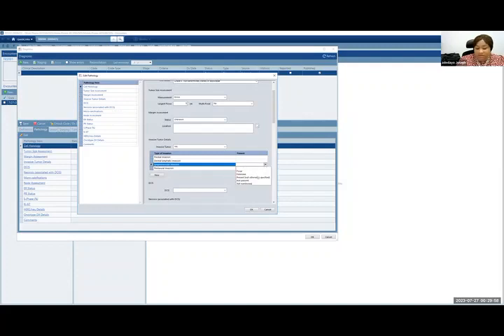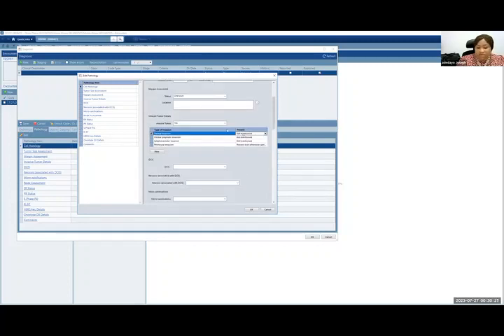Is there lymphovascular invasion? Did they say there is no lymphovascular invasion, which is not present? Did the report say it is present, but didn't say more than that? Did the report say there is focal lymphovascular extension, extensive lymphovascular extension, or was LVSI not mentioned at all? Dermal lymphatic invasion not mentioned at all. Dermal invasion not mentioned at all. So again, we need to be as detailed as possible in filling this in.